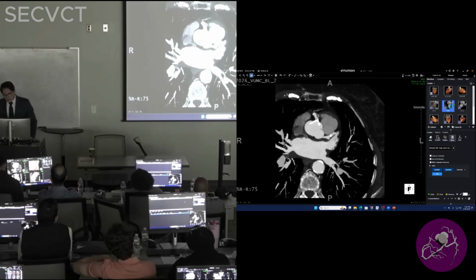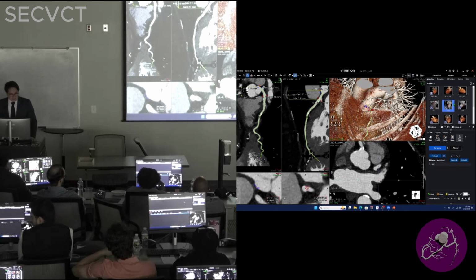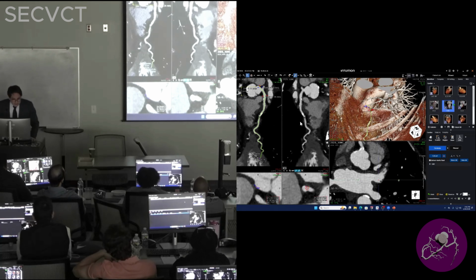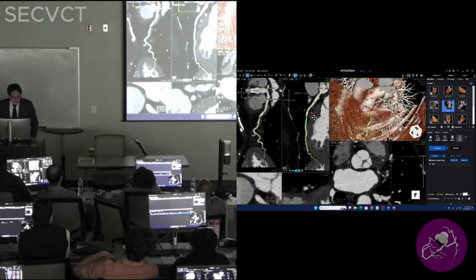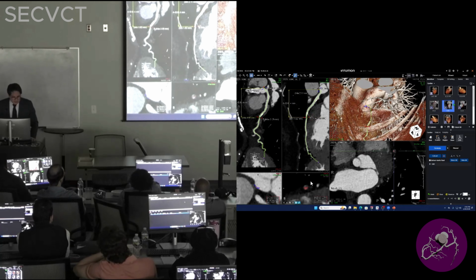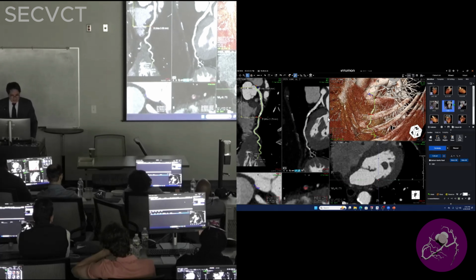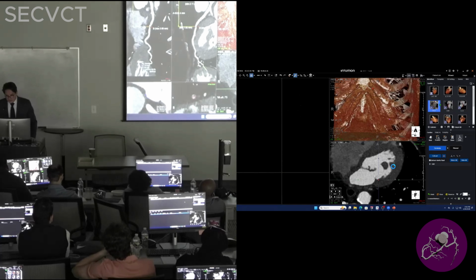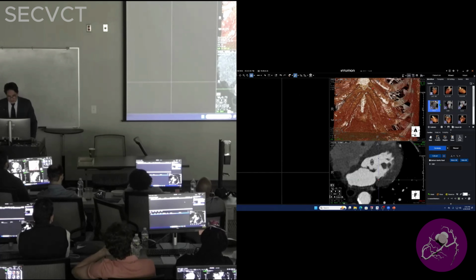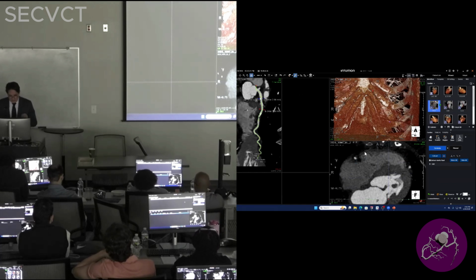Now, I'm going to go to the thin slices. So I have my LAD. The LAD looks like there's something here, right? There's some lesion over here. If I go down to this area, it looks pretty severe, right? And then we have the RCA as well. We have to locate the RCA here. I can just click it.